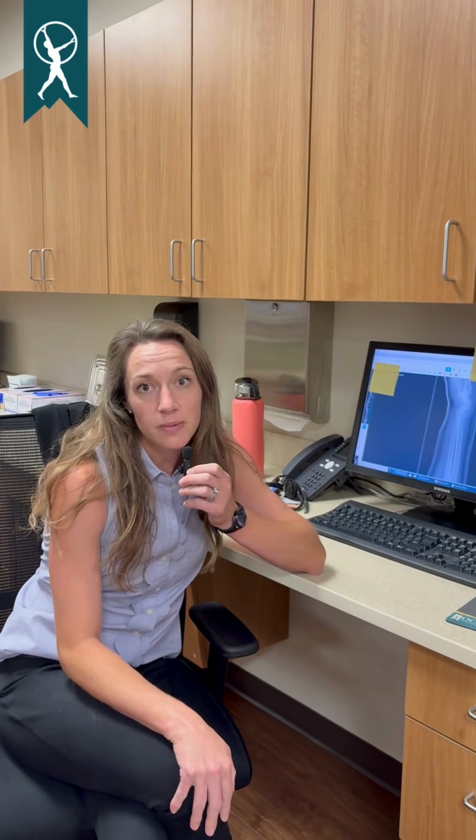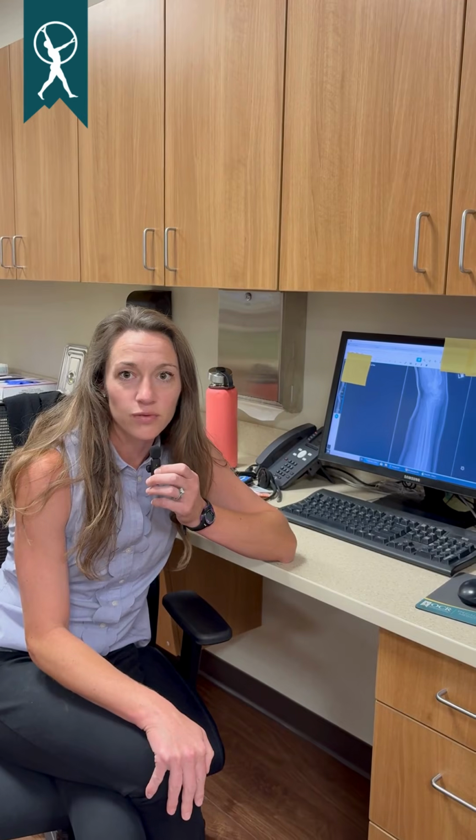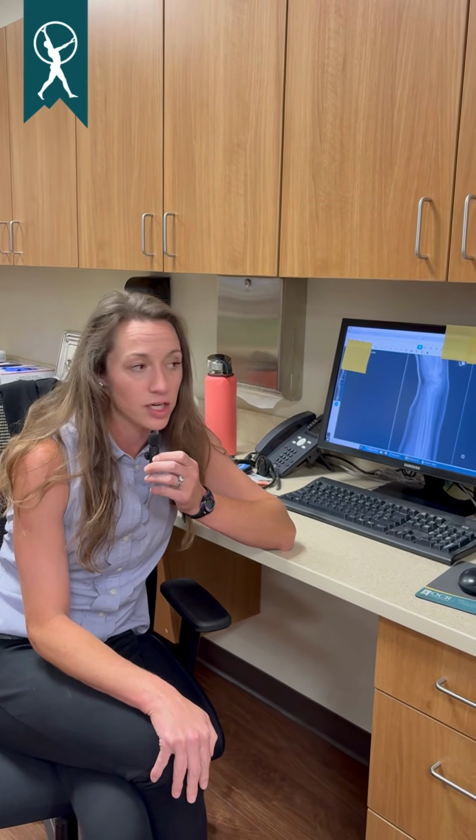In this woman, she is a postmenopausal female, and this is an indicator of osteoporosis. And for this reason, I'm recommending that we get a bone density scan to further assess her risk factors for additional fractures, including that of a hip or spine fracture.